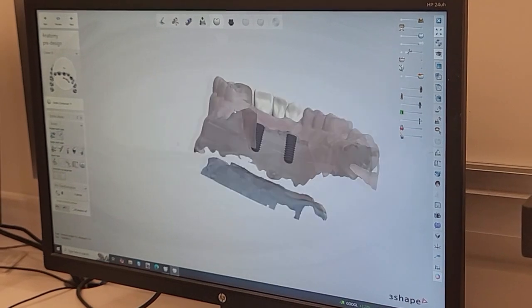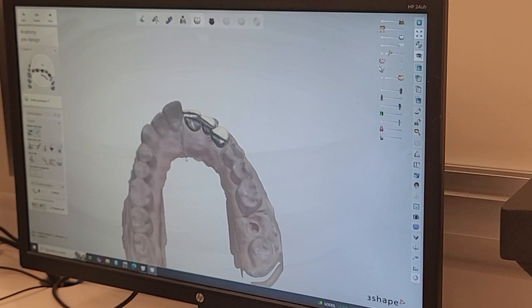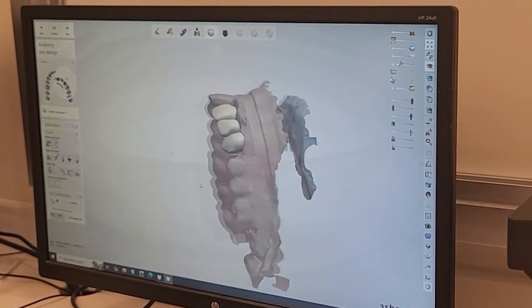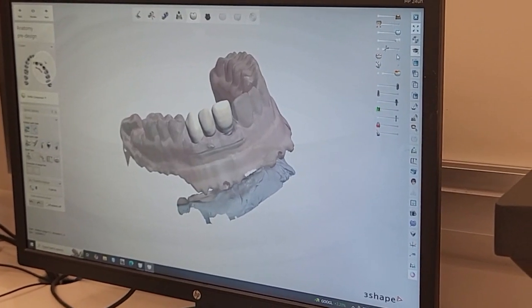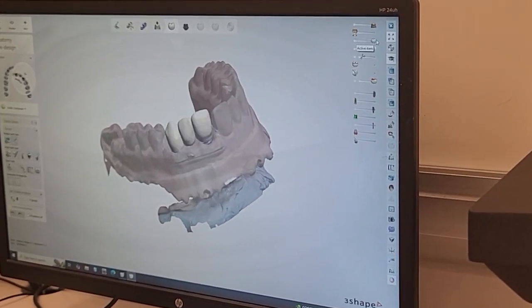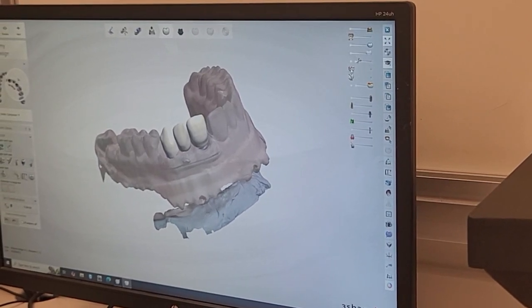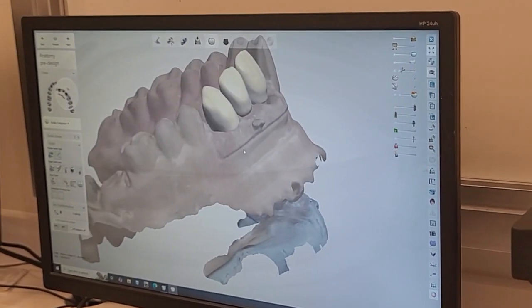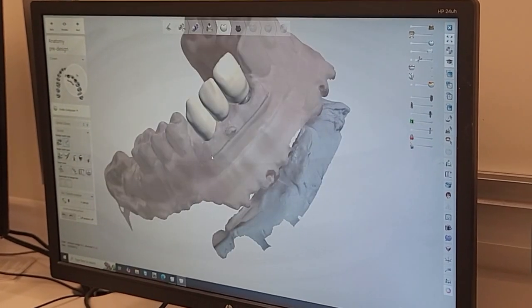Now, when I give an order, the computer generates a design. It's not perfect, like you see, so we can work on it. And again, look what happened here. Now we have more stuff added. So we have the bridge, and you can move on. This is for when you do the design, to see if your contacts are too tight or too big or too small.